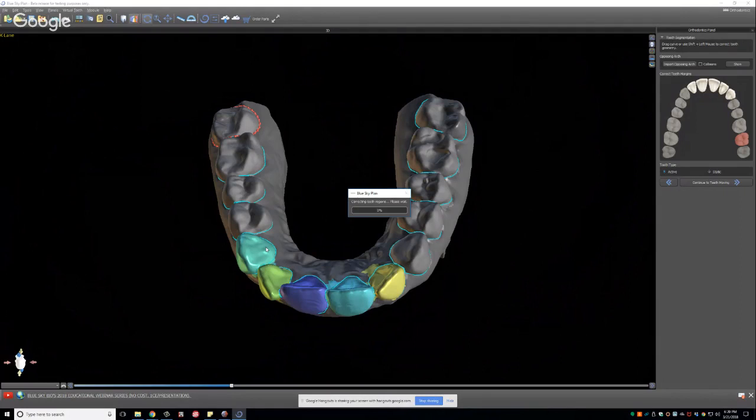Once again, this is the next big step, and there's really just those 2 steps that would take a while when you have a pre-closed model.